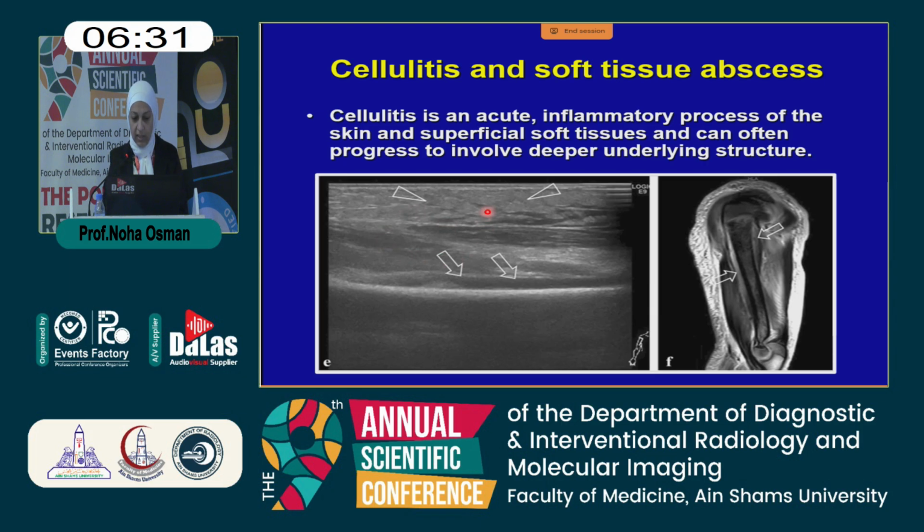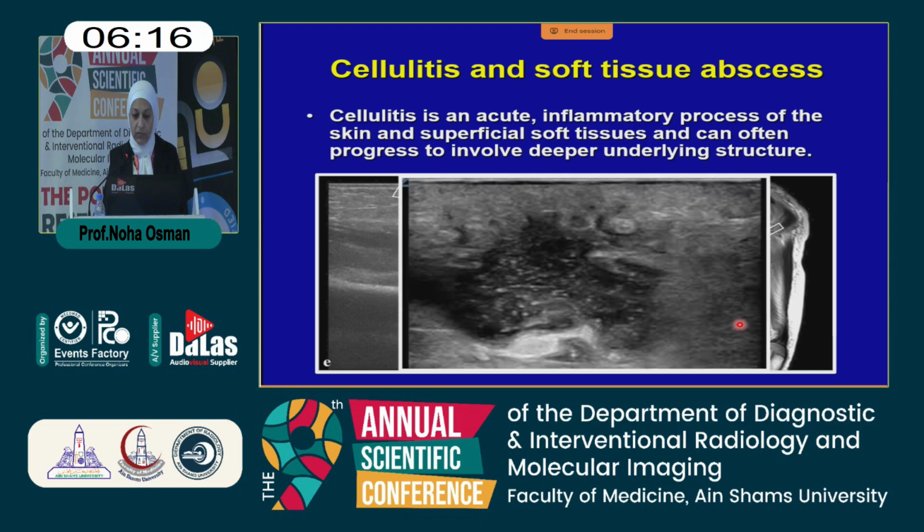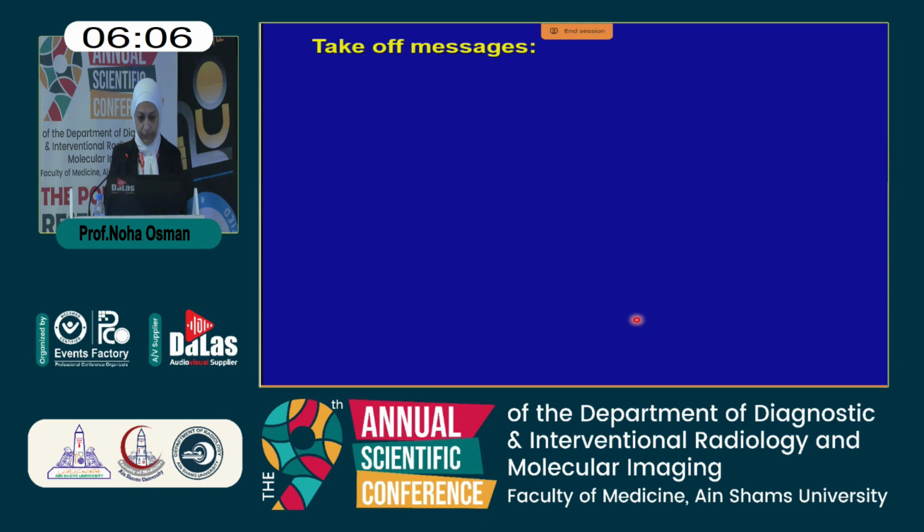And in this case, the ultrasound revealed the cellulitis and underlying subperiosteal elevation and subperiosteal collection, denoting that osteomyelitis was the leading cause, and the MRI proved the presence of osteomyelitis. Cellulitis could proceed into abscess formation, which appears as a cavitation with internal different echogenicities and echoes.